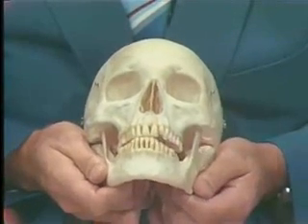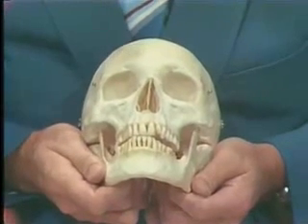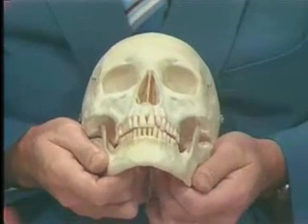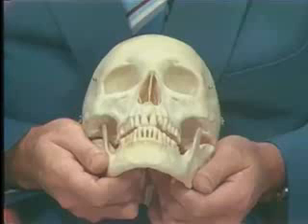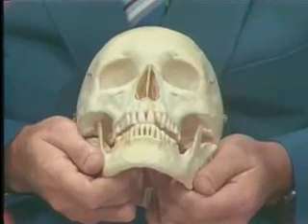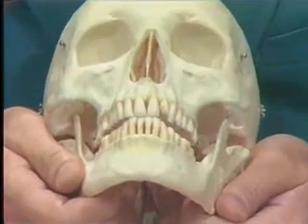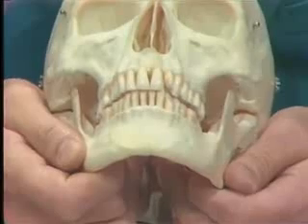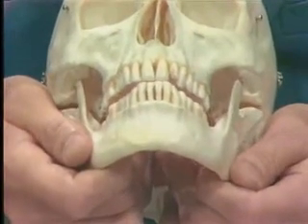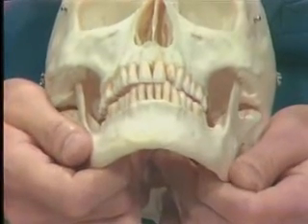See, you notice on the side that's a working side, you have contact between the teeth, and on the side referred to as a balancing side, there is no contact on the teeth. The other movement then is protrusive, and when you come anteriorly forward with the mandible, straight forward, you would find the anterior teeth contact, and there's no contact in the posterior area unless there are interferences present. So we go through that once more and move it straight anteriorly. That's an incisive action then, and this is guided by the anterior teeth.